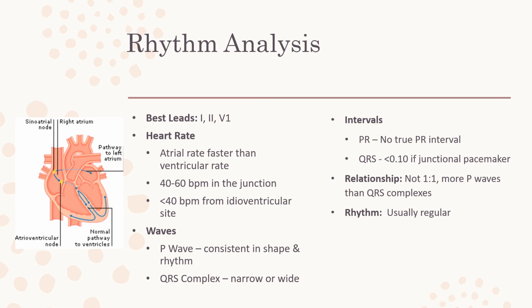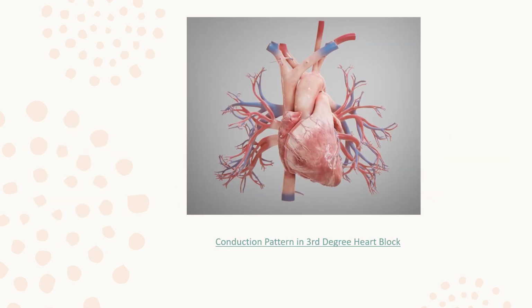The relationship between the P's and the QRS's is not going to be 1-to-1. There are going to be more P waves than there are QRS complexes, and the rhythm is usually regular.